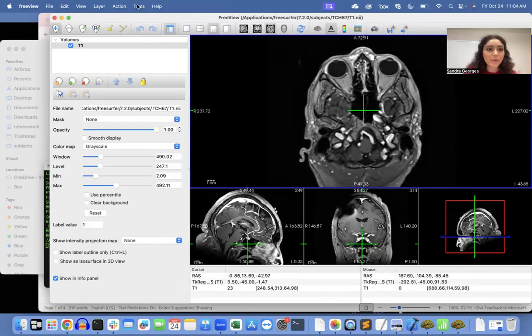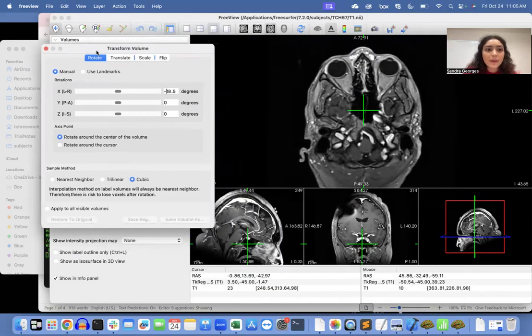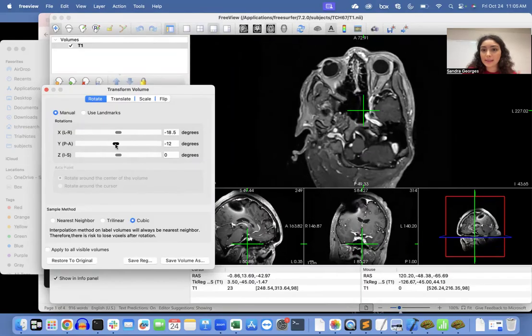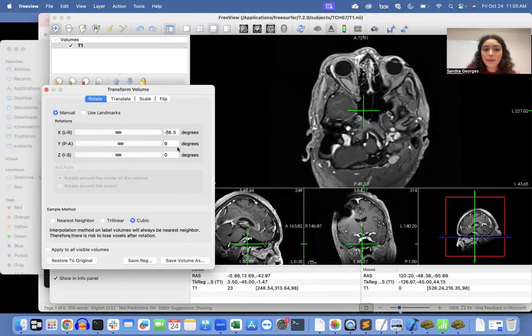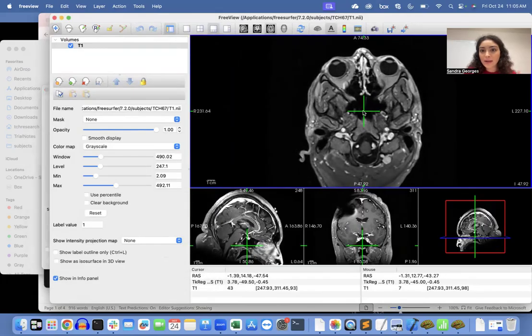I guess I can show you as well, for your own information about the eyes, if you did happen to see that they were not coming in at the same time. So, for example, I can move these back and forth. So this is the Y direction, but let me show you a little bit earlier on.